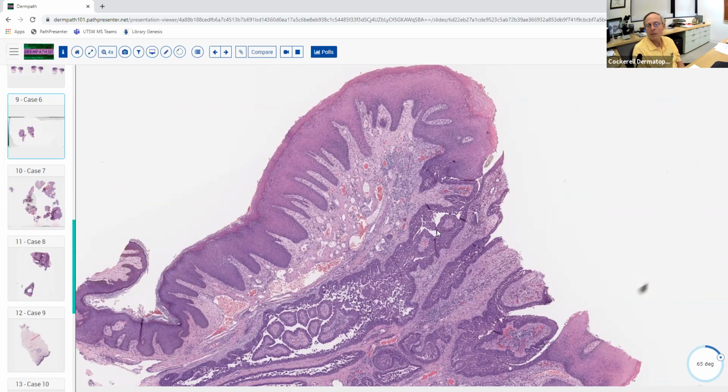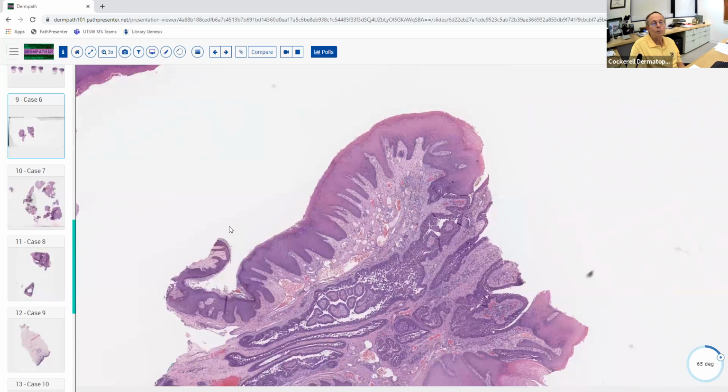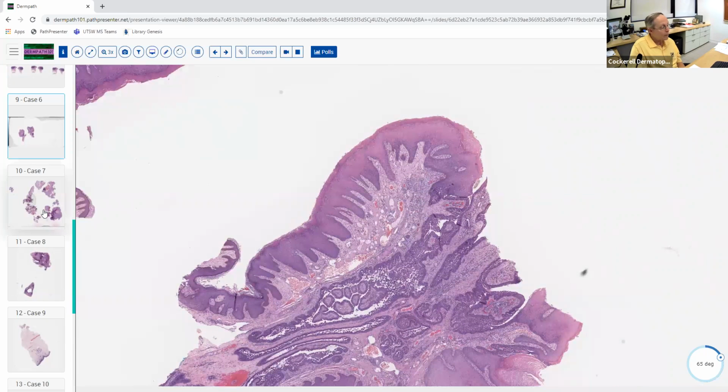It's a little bit different, but it's in the same general family. So you can think of it as analogous in a way. And the breast tissue is really a giant apocrine gland, and that's where it came from in the embryo. So it makes good sense that it would make benign neoplasms that can look like apocrine neoplasms. So that's a nice example of Syringocystadenoma papilliferum.